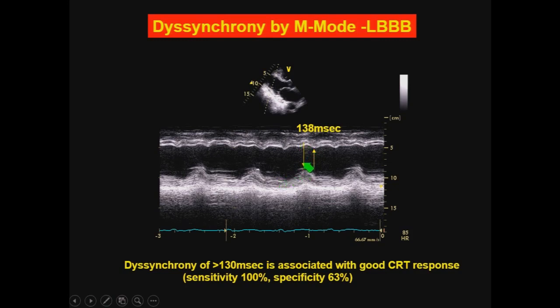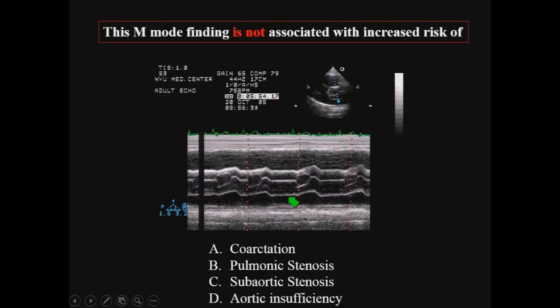While this wall is moving anteriorly, that wall was supposed to move backward, but you see that the backward motion took much longer, and there is a big distance between the peak motion of the posterior wall and the peak motion of the anterior wall, and this is really the demonstration of desynchronization. So this is poor man's desynchronization, but let me tell you, it works as good as everything that you do with tissue Doppler and with whatever you are using.